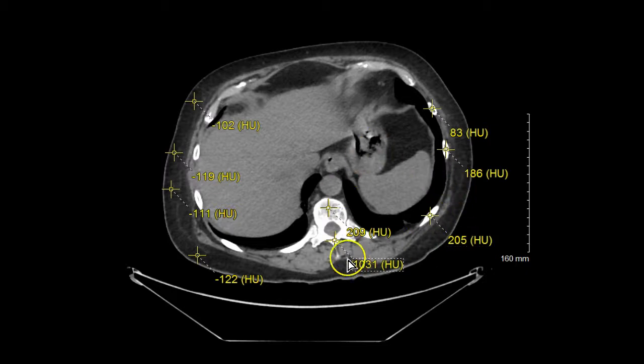Look at the difference in the spine once we get towards the spinous process. There's a little bit more dense bone in this particular region, and you can see that by the given brightness associated with it. As we go around, you can see some of these different point structures that are associated with bone. So very, very high numbers in comparison to some of these lower numbers. Continuing the concept forward, let's look at some of the lungs.